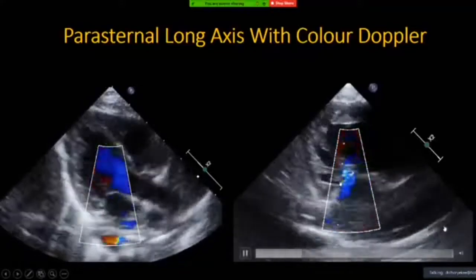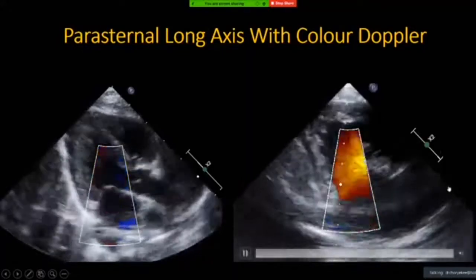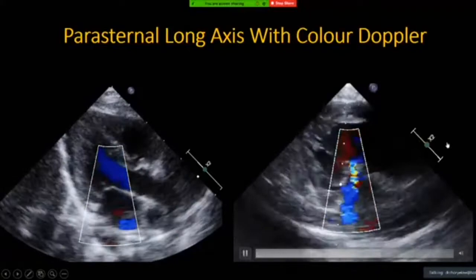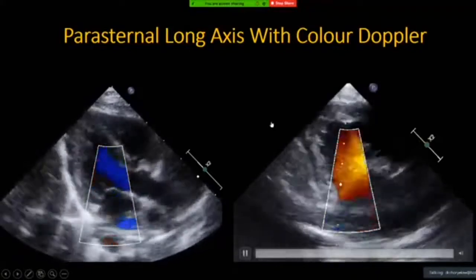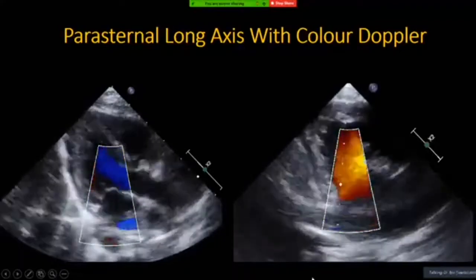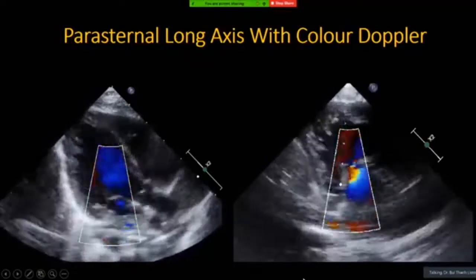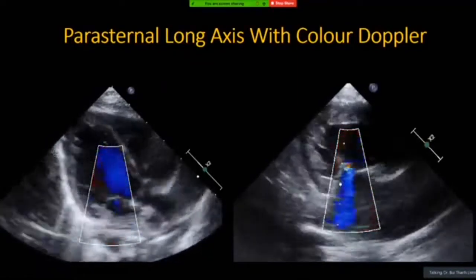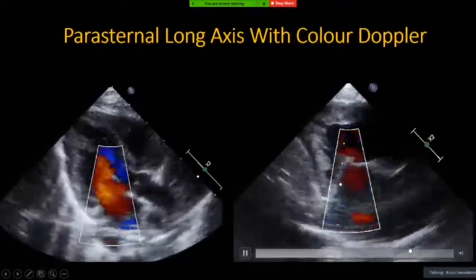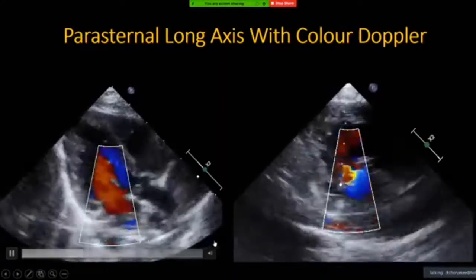All right, so let's say that this child presented to you at 3 weeks old with desaturation. So you put the ultrasound probe in the parasternal long axis. This is what you see. So what's the thing that you see here? Dr. Dong comments there is a tricuspid regurgitation and hypertrophy of the right ventricle, and Dr. Dong thinks maybe there is pulmonary hypertension.